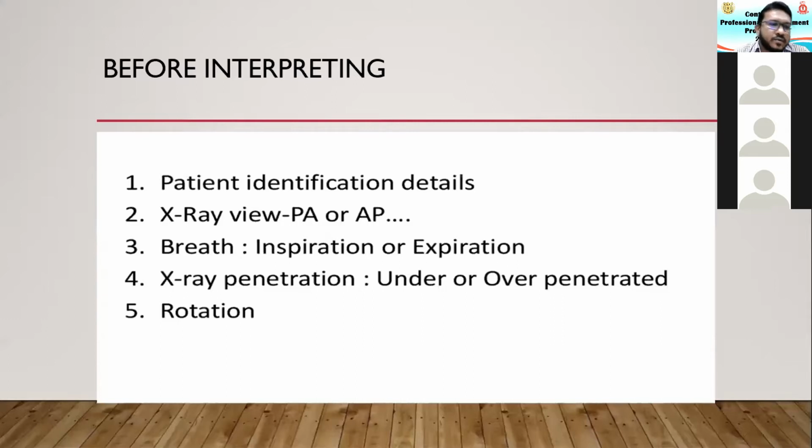And then you have to recognize whether it's adequately exposed, and whether there is adequate inspiration or expiration, as some of the subtle changes which you might interpret as abnormality are rather technical faults. And then most importantly, you have to know whether it's rotated or not.